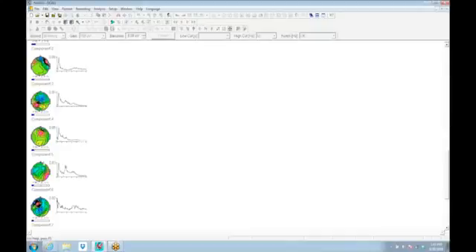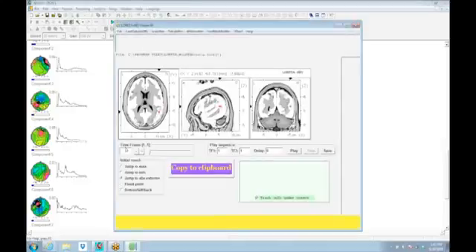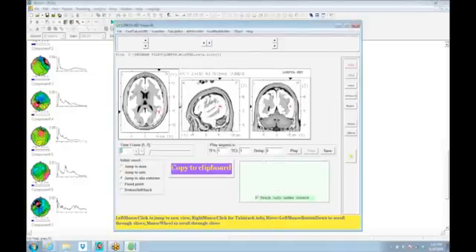Here we have a very weak component on the total amount of variance, but it's a right temporal alpha component. And see if we'll get a Loretta run off that. There we go. This generator ends up having this as the generator site, the superior temporal gyrus, right side.